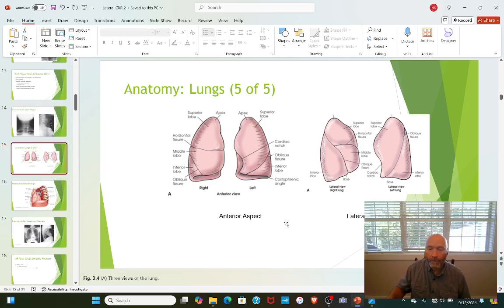The lower lobe extends from the bottom of the lung close to the top of the lung. The middle lobe is truly in the middle, but it also has some contours that make it very difficult to identify exactly what portion of the lobe the middle lobe is. If you look, it goes from about the middle of the lung all the way down to the base. And then the superior lobe likewise goes from the top almost to the bottom.